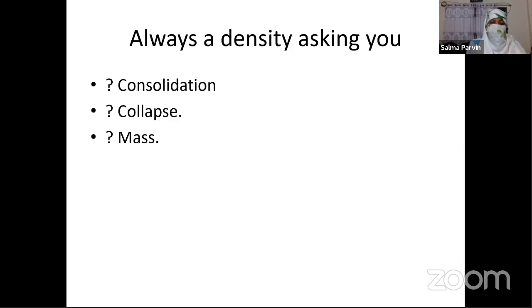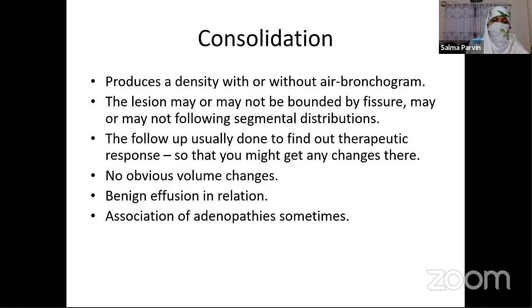And what is a density in the X-ray field? Asking you, is this a consolidation, a collapse, or a mass? And you have to answer these three things nicely. So let's have a review about the lesion seen in the X-ray chest, whether it's a consolidation, a collapse, or a mass.